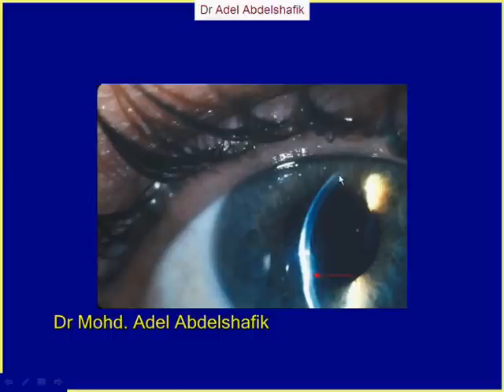Now we see this image. What do you notice here in the section and this part? It seems we have a lesion here, something different, and the section here, thickness, and this thickness here. So this part is thicker or thinner? It's thinner. We get thinning of the cornea in this part.